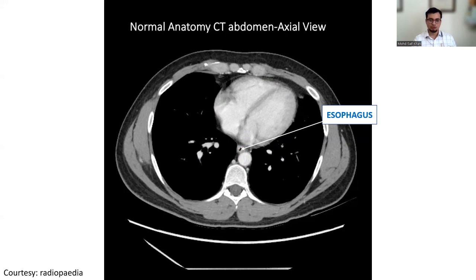And behind the esophagus, you can see the bright structure, which is nothing but the aorta. So this is your aorta. It is quite round compared to the IVC. It is quite round. Here you won't be able to see the IVC. So the IVC will be coming from the RA. Okay, this is your RA. I think later I would show you.